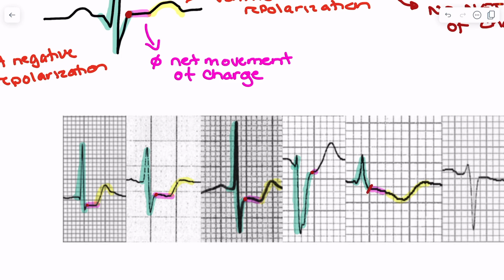So we see, again, the cessation of the positive or negative deflection of the QRS complex, followed by a period of rest, and then the T wave. Again, in our final example, we can do the same thing. So we're looking at positive and negative deflection from baseline, followed by a period of rest, which we can outline here, which would then mean that our J point is going to be here. So again, some strategies for you in terms of locating the J point.